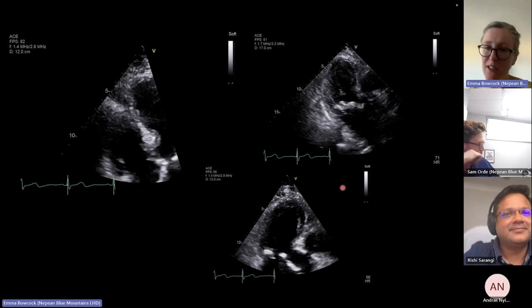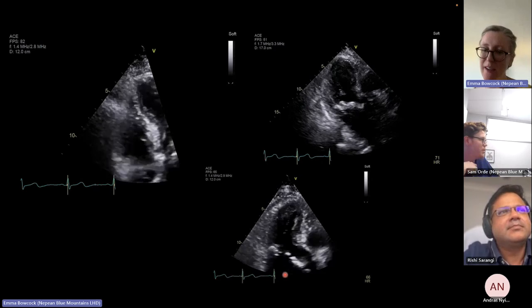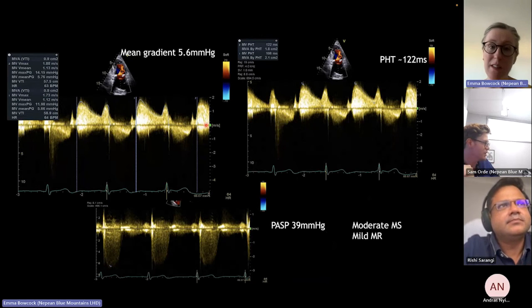And then again, I just wanted to hear that class about mitral annular calcification, because I think you were saying calcification of the leaflet tips, and you can see the leaflet tips here, they're relatively spared. Yeah, it's a little bit pedantic. And then the mean gradient, 5.6. So yeah, between that 5 and 10. So who knows, it's elevated, right?